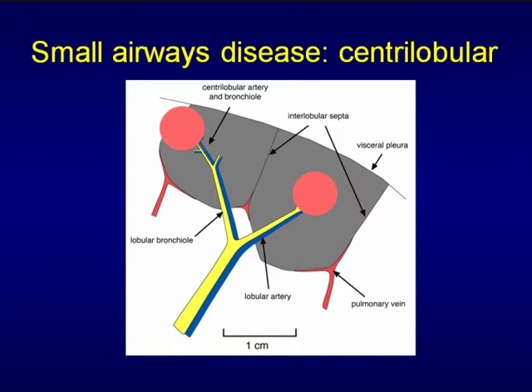And they affect the center of the pulmonary lobules in different ways. And the manner in which they affect that pulmonary lobule, whether there is filling of the airway, interstitial inflammation surrounding the airway, dense consolidation surrounding the airway, or airway obstruction, will determine what the radiology looks like. And so my goals today are to talk about the different CT patterns you may see and how they relate to the particular diseases that cause them, and also to really give you a sense of why we're seeing what we're seeing. And I think the key to that is really understanding the pathology.